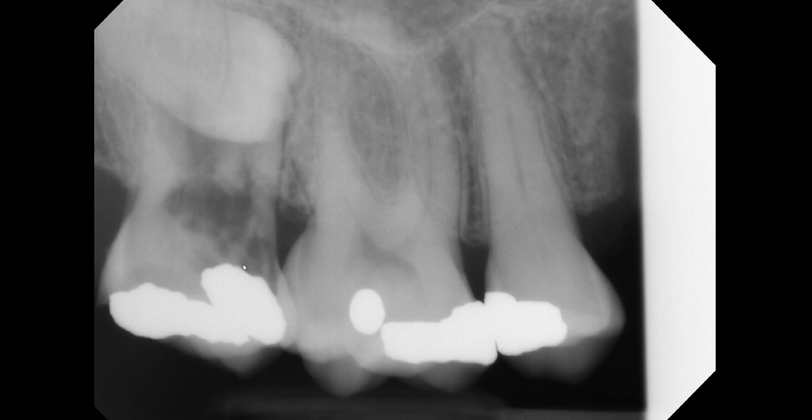So if you have said either internal or external based on what we have now, both are very acceptable answers. But in order to rule out or to get a definitive diagnosis, I think we need a cone beam CT scan. Having said that, let's talk about the potential treatment options. Given the extensive resorption patterns that we see, I hope you'd agree with me that this tooth has a poor prognosis and most likely needs to be extracted.